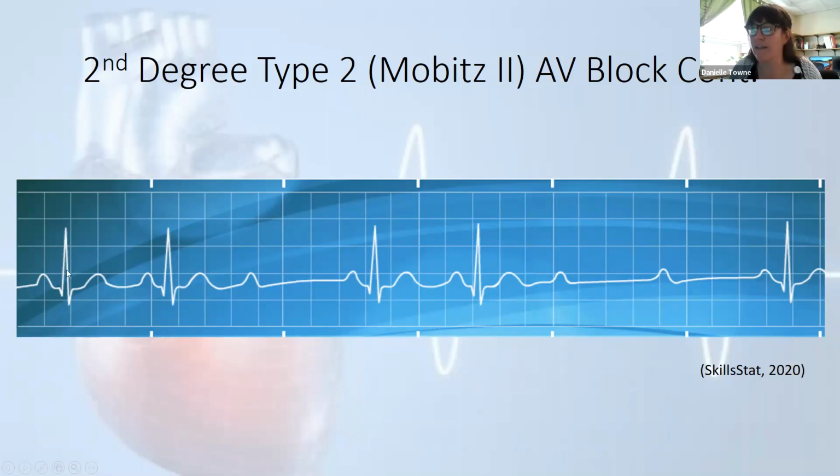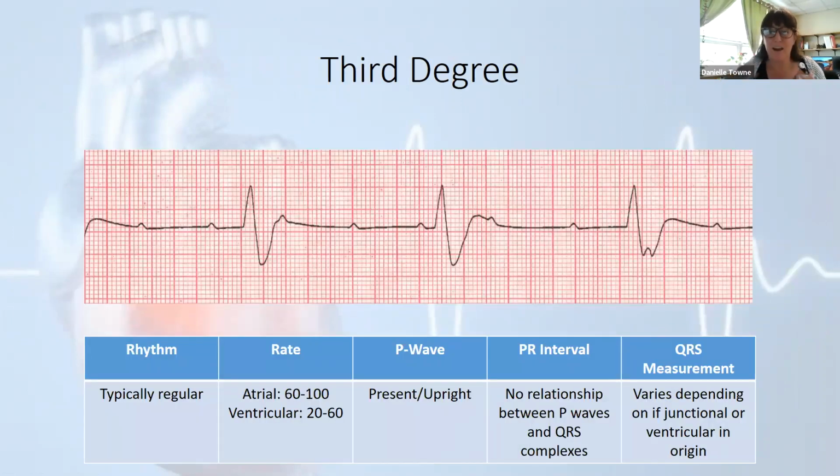So when I look at this, I'm actually only seeing a rate of about 50, which for a lot of people is not going to be enough, especially when it's trying to be 80. Right? That's where all these P waves, they're sending out impulses saying, hey, I should be beating, like we're going on a good schedule, and only 50 are getting through. That's not okay.